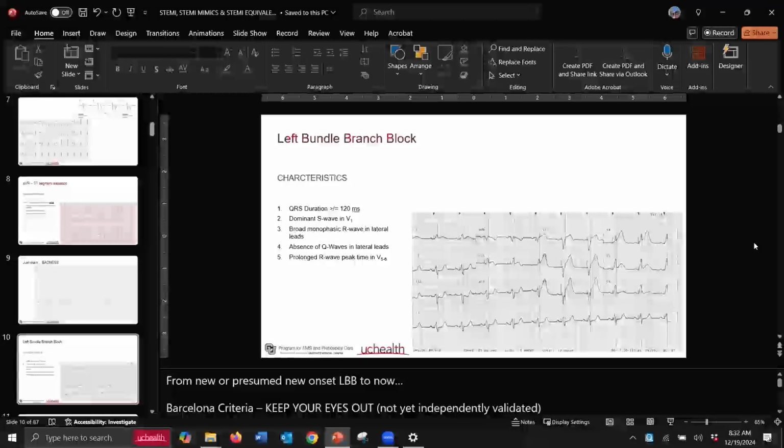Okay. There's this whole thing called the Sgarbossa criteria. Even further specific is the Smith modified Sgarbossa criteria. And yes, you can, with a fair amount of sensitivity, determine whether somebody meets ST elevation MI criteria in a left bundle branch block or ventricular paced rhythm. Okay. So even V paced versus left bundle, it's the same characteristics.